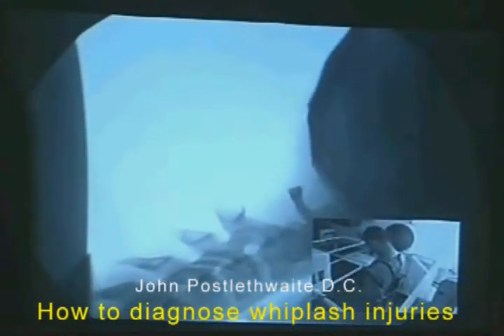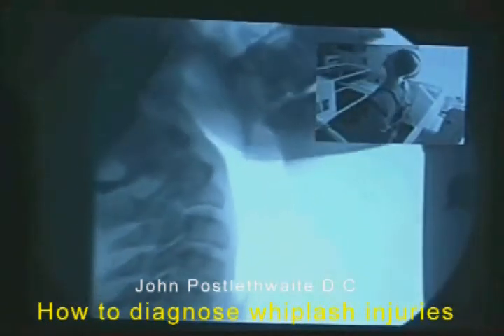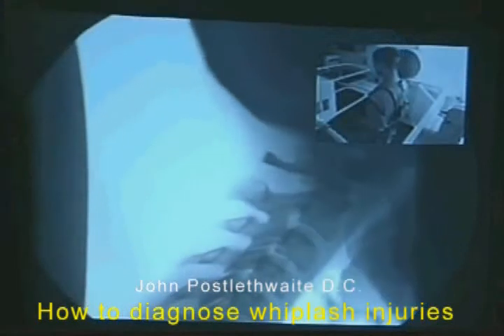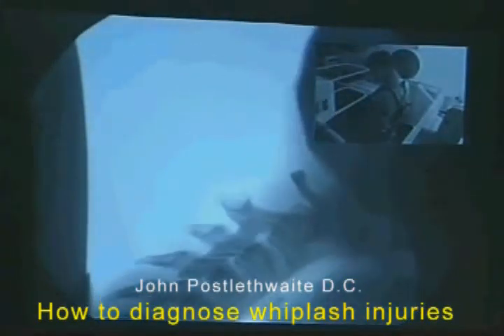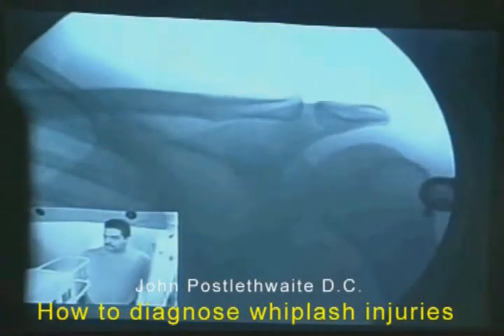Here's another one. He was okay. They wired him together. Here's another one here. Boom. Now, I see these all the time. And if you've seen what I've seen, you won't touch anybody until you've done one of these. It's just amazing. Shoulders are incredible.